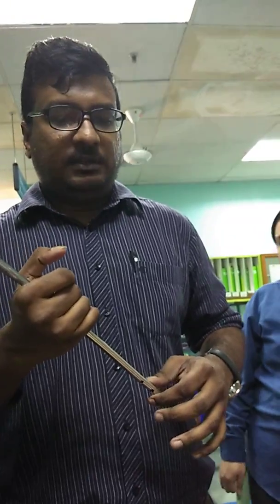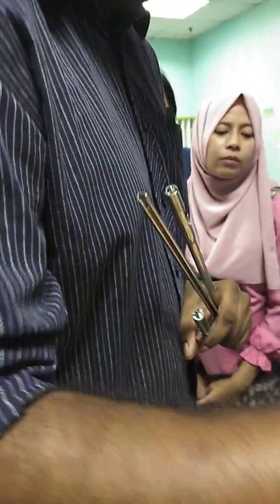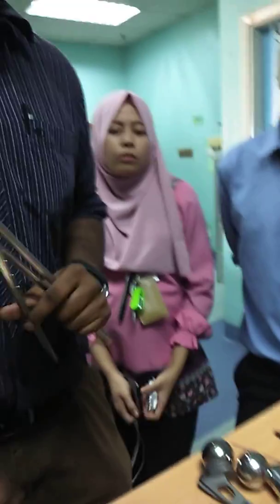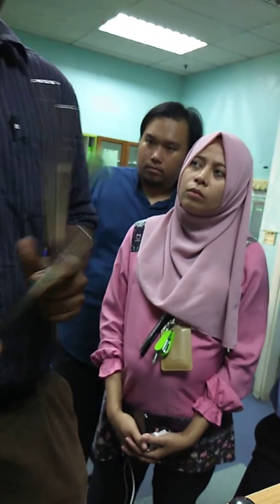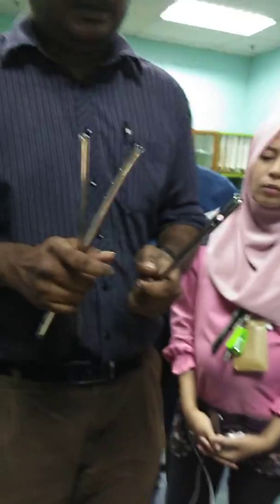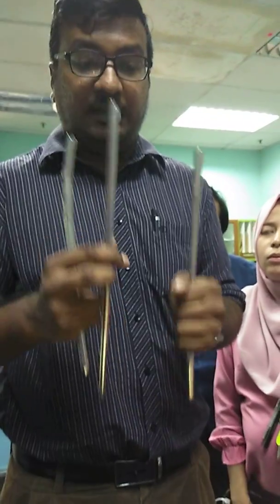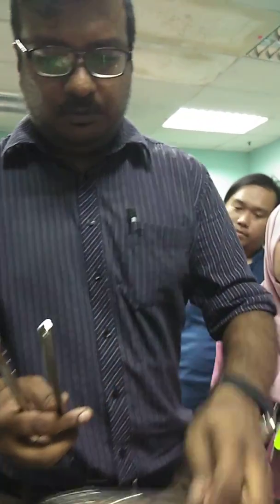Okay. The only plates we expect primary healing from are DCP and also locking plate. Okay. Your neutralizing plate we don't expect primary healing. Okay, secondary healing because it's just meant to hold the bones only. Okay, so there will be callus formation. This one also we expect secondary healing. Okay, because it's splinting the bone from inside.